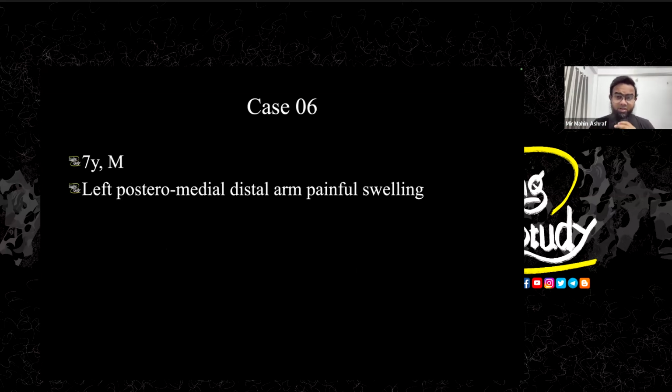So now come to case number 6. So it's a 7-year-old male patient who had left posteromedial distal arm painful swelling. So this is not an abdominal case. This is the arm case, very commonly seen in our practice.